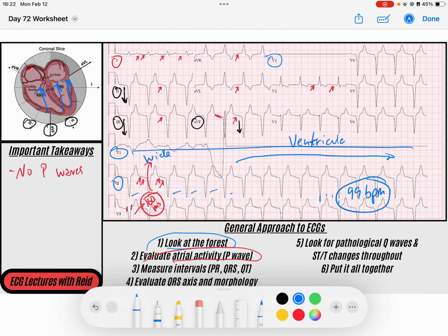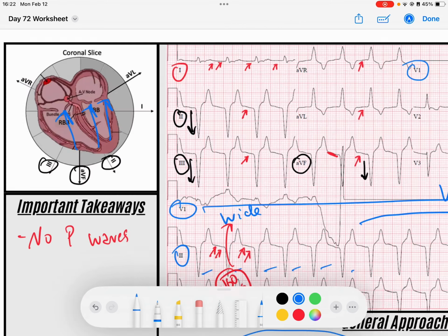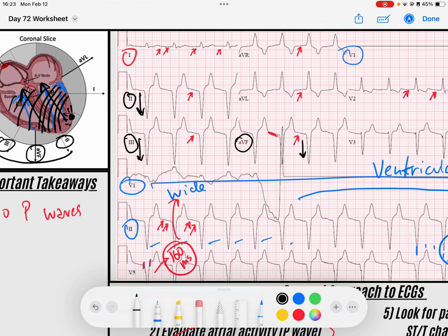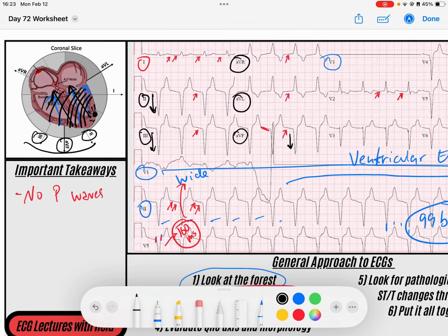Ventricular rhythm. It's coming from some ectopic focus. So there's some ventricular ectopy. There is some focus somewhere inferiorly within the ventricles that is firing off, causing slow depolarization, not through the His-Purkinje system, but through the ventricles, that is creating signals that are going away from the inferior leads. And it's going towards some of my superior leads, right?